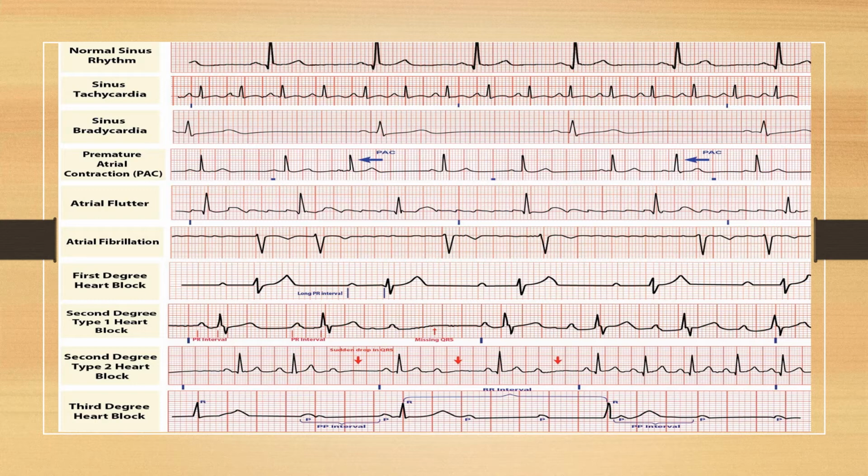Now, the next question is, are there P waves before every QRS? And when I look at this, I actually don't agree with this one. So I'm seeing actually little tiny upside down P waves between the QRSs. And you'll see those little squiggles going down over and over and over again. This is actually atrial flutter.